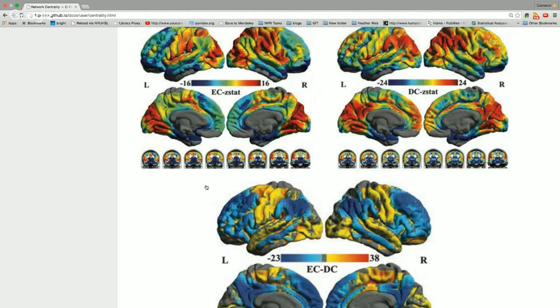So if we're interested in the local FCD of this voxel right here, what we're interested in knowing is how many voxels are in this region. Right? So you want to find all of the regions that are in that local blob. So you could take the map and then threshold it and then just find the region that contains the seed voxel. And so global FCD would include all of these regions, right? But with the local, you're just interested in that.